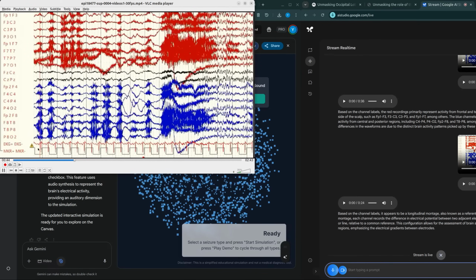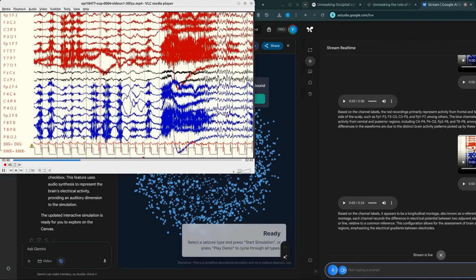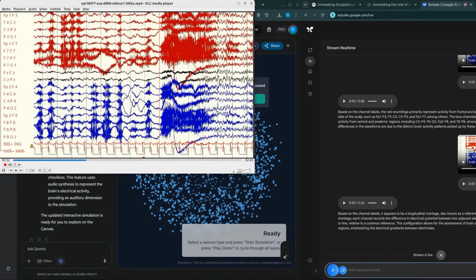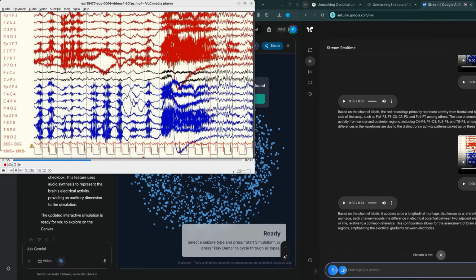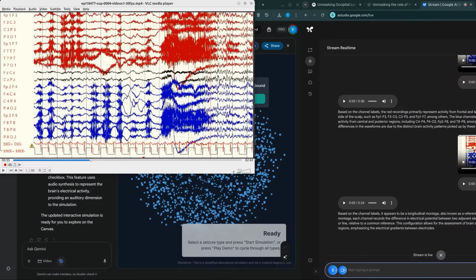Okay, this is really nice. So I'm playing the rest of the video. What's currently happening? What's coming in the signal? Can you again continue pretending being an EEG expert and tell me what's happening?